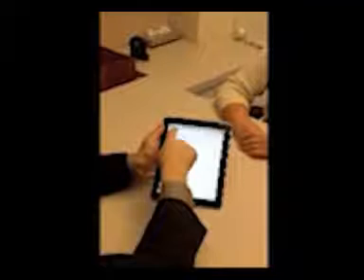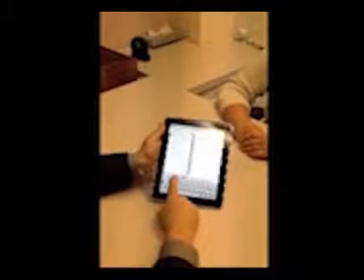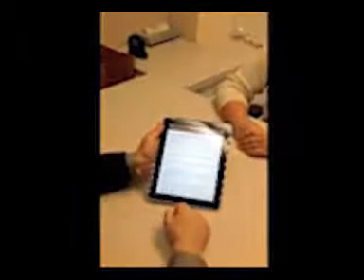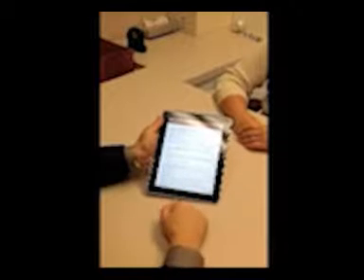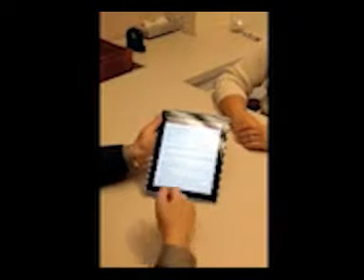Once you've scored and printed the report for the MOST, we're going to send it as a PDF into an email address. So the email successfully sent, you're going to be able to attach this to a medical record or print it out for placement in the patient's chart. And that's it. You've completed the MOST, and it's on its way.